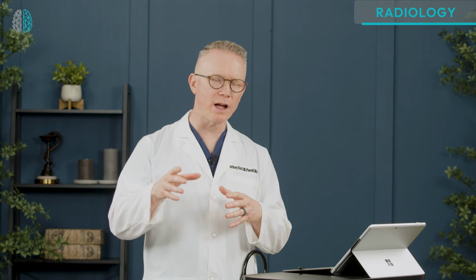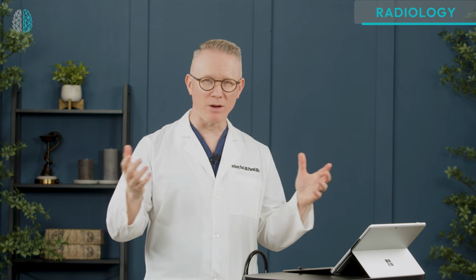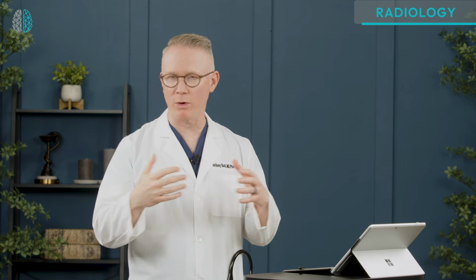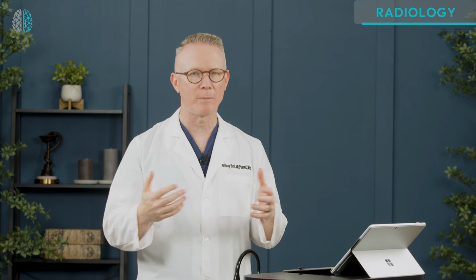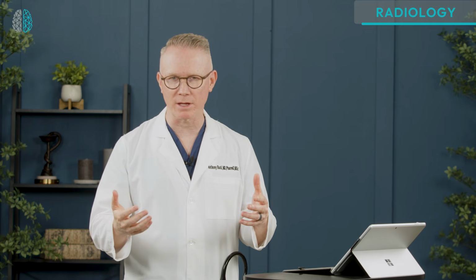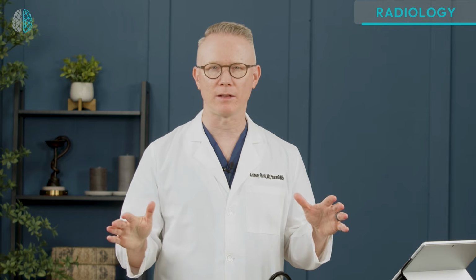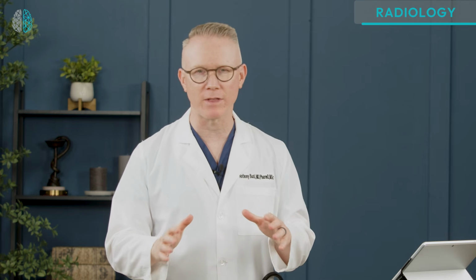Third, ignoring coverage and assuming normal, right? Declaring a film as normal without the apices being fully there, or with the costophrenic angles being cut off, puts you at greater risk of missing something. So my suggestion to look at any x-ray or any radiographic image for that matter is this. If you can't see it, you can't clear it.